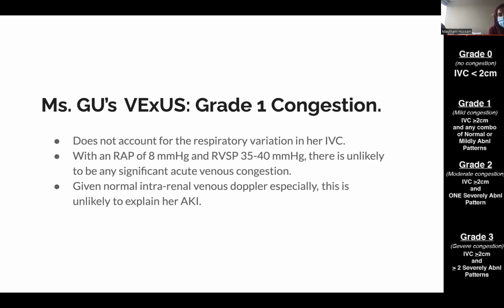Regardless, she did have a normal intrarenal venous Doppler. So venous congestion or a cardiorenal syndrome is unlikely to explain her AKI in this setting. So we did recommend that the medicine team consider alternative etiologies for her AKI.